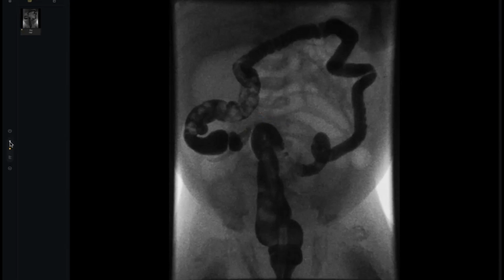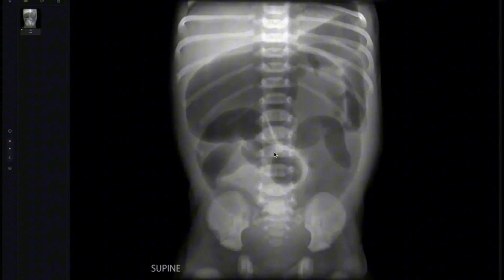What happened to my colleagues? In this X-ray, there is bowel dilatation. It may be lower or upper GI obstruction. Really, we don't know. If you tell the examiner there is a bowel obstruction, you can ask, doctor, what is the history?